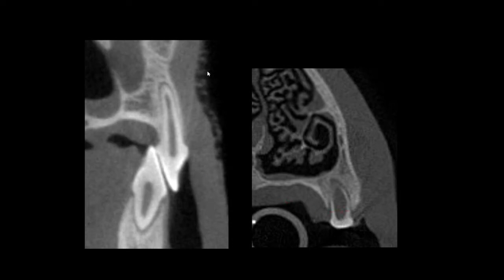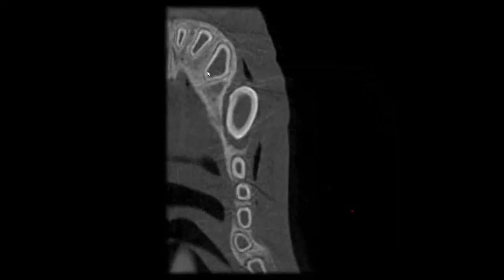Also, recognize there's a distance between the crest of bone and the cemento-enamel junction, which we expect to be maybe 1.5 millimeter, but there can be some variation. And here on the palatal aspect of this particular tooth, we see a distance that's probably greater than what we can measure on the buccal aspect. So there is variation in the distance between the crest of bone and the cemento-enamel junction, and that is also within normal.